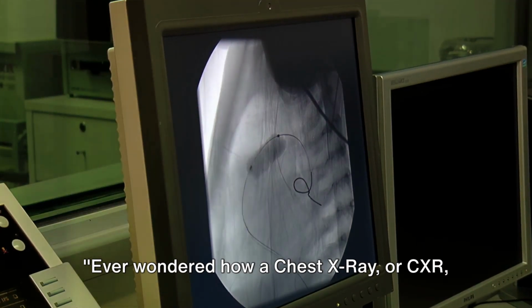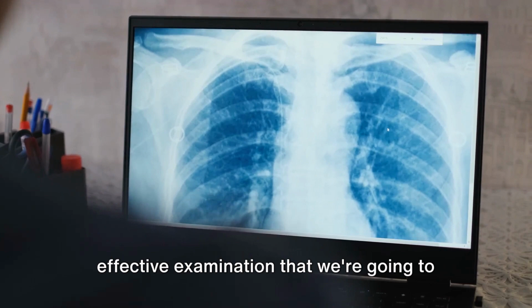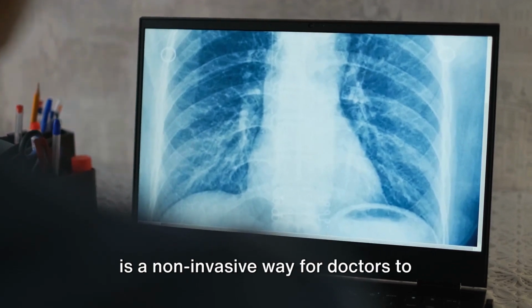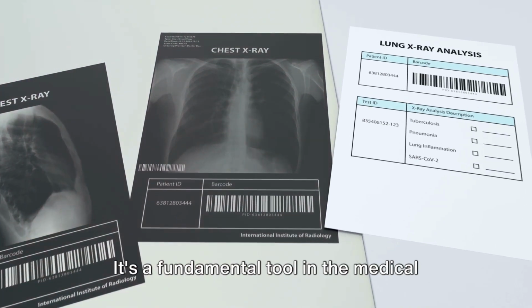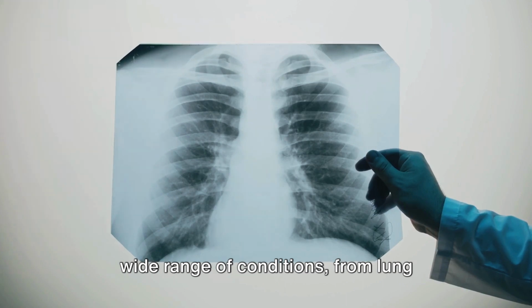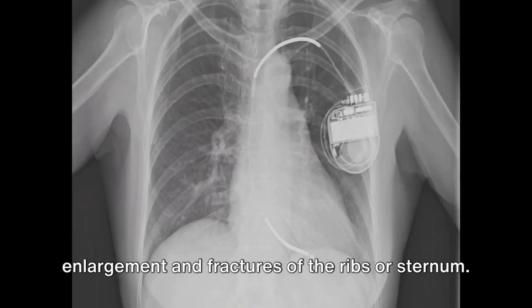Ever wondered how a chest X-ray or CXR works? It's a crucial yet simple and effective examination that we're going to explore today. Like a window into the human body, a CXR is a non-invasive way for doctors to visualize what's happening inside your chest. It's a fundamental tool in the medical field, allowing for the diagnosis of a wide range of conditions, from lung infections and tumors, to heart enlargement and fractures of the ribs or sternum.